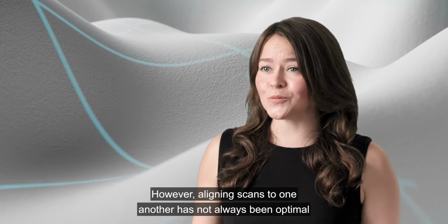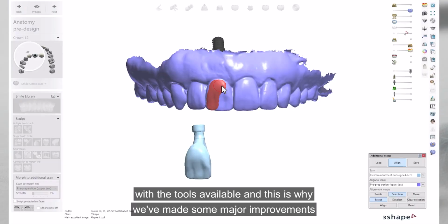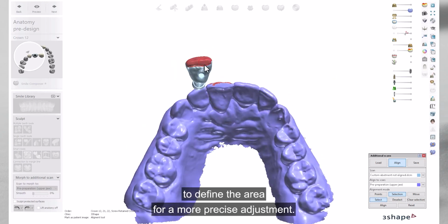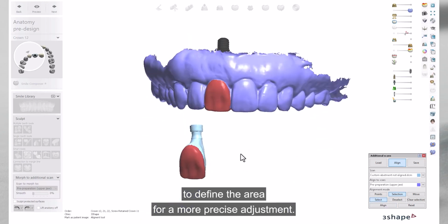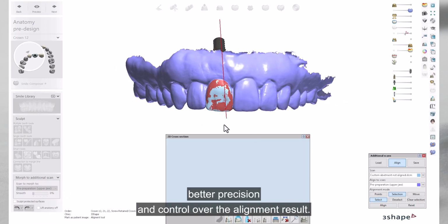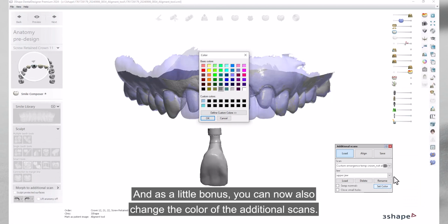However, aligning scans to one another has not always been optimal with the tools available, and this is why we've made some major improvements in the selection alignment mode, where you now have the possibility to define the area for a more precise adjustment. With this, you can pretty much achieve better precision and control over the alignment result. And as a little bonus, you can now also change the color of the additional scans.